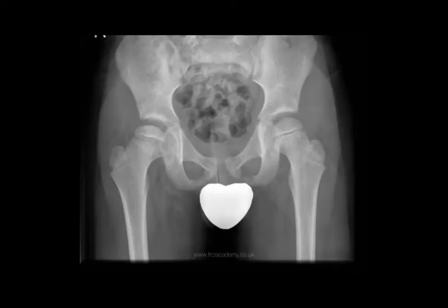Okay, now I want to give you a clue, but we already mentioned this many times. When you have an X-ray pelvis of a pediatric patient, you have like 3 or 4 diagnoses. Right Perthes, perfect. You see the density of the bone of the epiphysis here compared to the density of the epiphysis here. You can also see some flattening and sclerosis. So you think that it will be right Perthes, perfect.